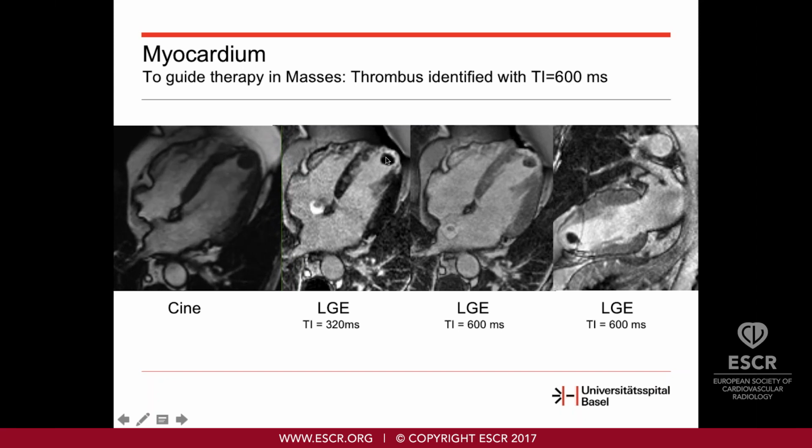And here you can see the resected metastasis, and here you can see this red 3D print, which is this one, which represents the metastasis. So this is a nice example that illustrates how MR or CT and MR imaging can help to guide therapy and to plan surgery.